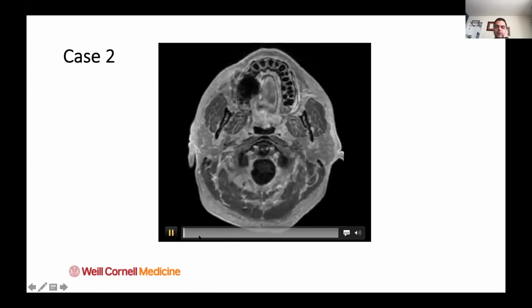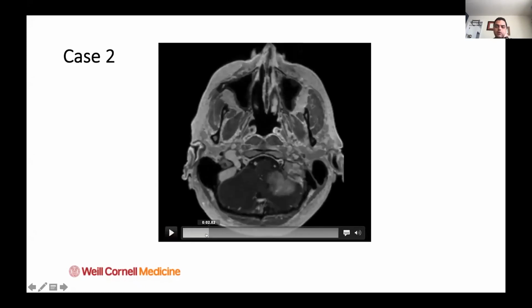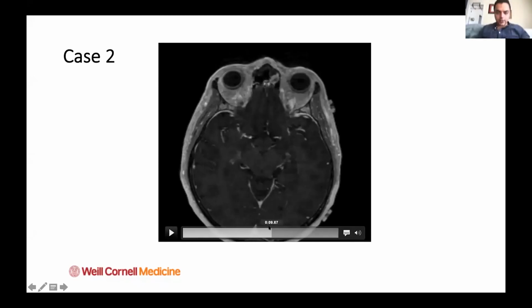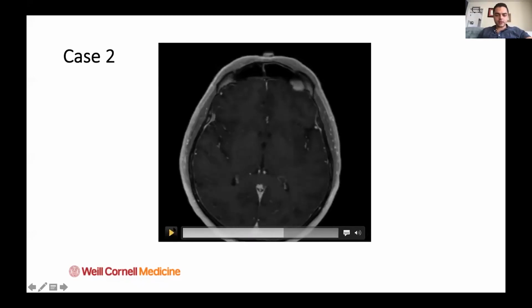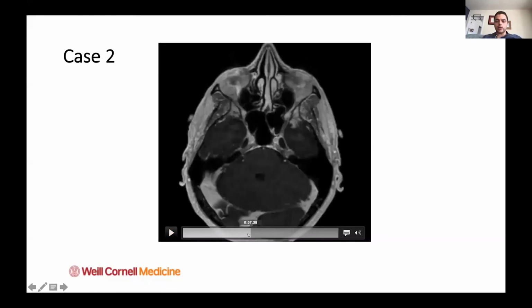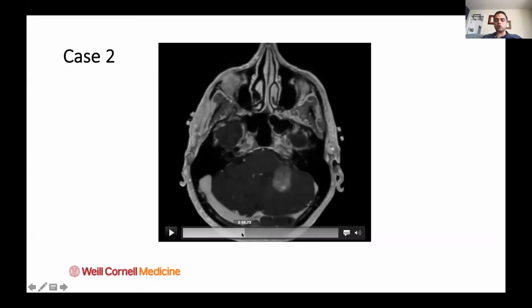And then here's an example of an MRI. Okay, so I'm sorry, it's not super bright here. It's a little tough to see, and this is my last slide now, so I'll be wrapping up any second. But here you see white matter is white, the cortex is darker, so it's T1. You see brightness in the vessels, in the sinuses, and in the choroid plexus. This is clearly a T1 post-contrast MRI.